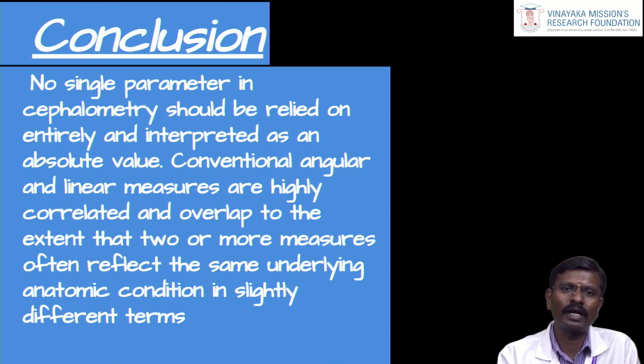With this also, you can correlate all the analyses and you can discuss with your patients. With the recent advances in digital dentistry, you can take and save photographs, and you can overlap the photographs with the patient X-rays, and you can do all the changes, both the soft tissue changes, and you can show your patient this is the post-operative picture of how you will look after the treatment. So with this, you can motivate your patient and you can start your treatment plan.